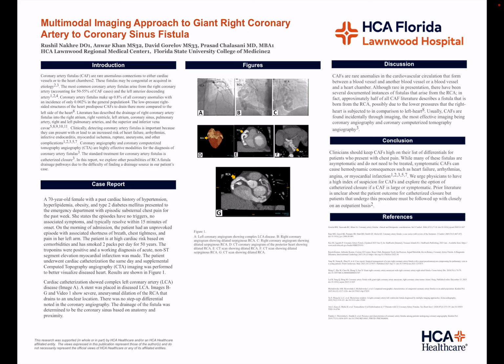Images B through G and video 1 show severe aneurysmal dilation of the RCA that drains to an unclear location. There was no step-up differential noted in the coronary angiography. The drainage of the fistula was determined to be the coronary sinus based on the anatomy and proximity.